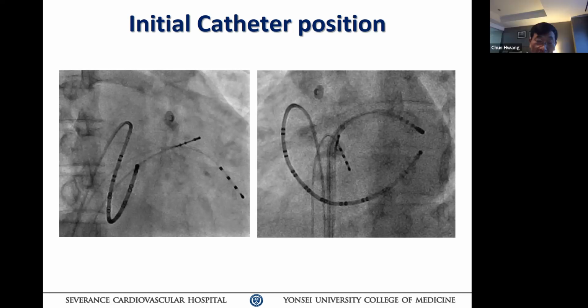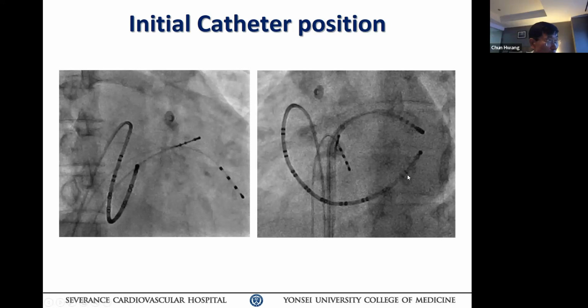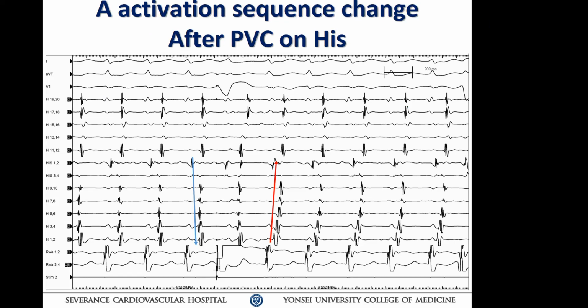So that's why you always interpret the EGM in relationship to your catheter placement before you jump to conclusions. Okay? All right. Go back to your tracing now. I just want to point out which is the dominant one and why that matters. You have to decide which one you're going to play first.